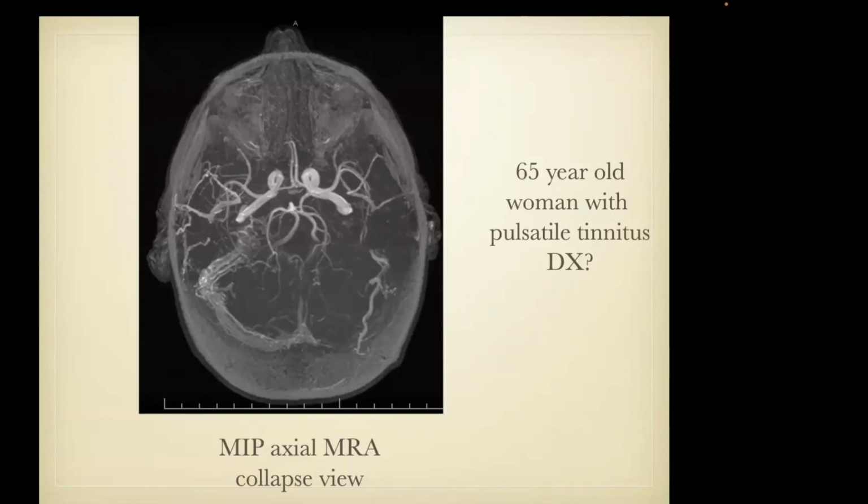Well, okay, but maybe this is a good time to talk about that. This is a good case to bring this up. We usually don't see the sinuses. This is a 3D time of flight MRA, not an MR venogram. So you see the high signal intensity in the carotid arteries, middle cerebral arteries, A1 segments, A2 segments. So we're emphasizing the arteries in this case. Usually on MRA, you don't see the sinuses because they have low velocity flow. So what's unusual in this case?